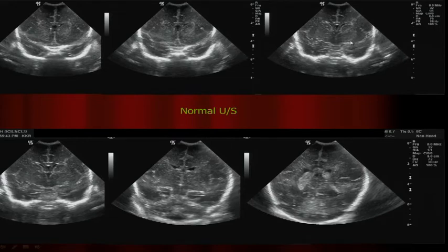This is the area of the external capsule, and then you have your, what is it? Claustrum or no? And then the extreme capsule. Yeah, but what's it called? It's claustrum. It sounds just like colostrum. It's not the milk with all the good antibodies and stuff. And then the extreme capsule, correct.